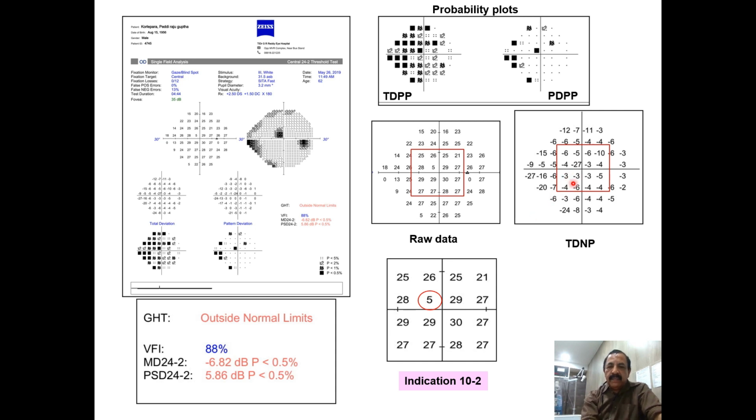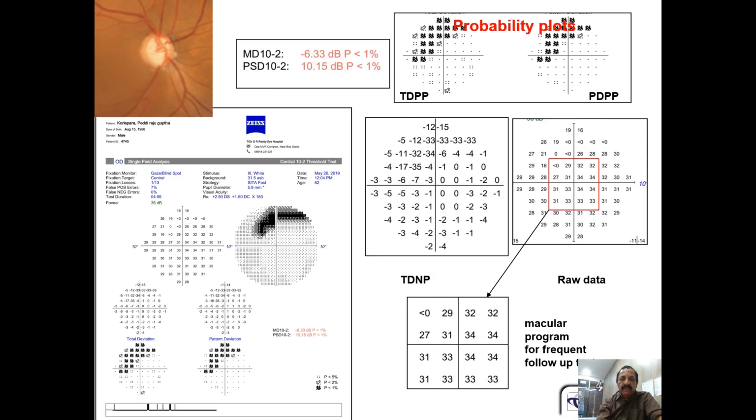That means the glaucoma started from this point at 3 degrees, and we have to ask for a 10-2, and the field is repeated with 10-2. And this is a 3-degree point with absolute scotoma. You see the points on this: this is the 7-degree circle, this is the 5-degree circle, this is the 3-degree circle. This area is involved with the deep scotomas.